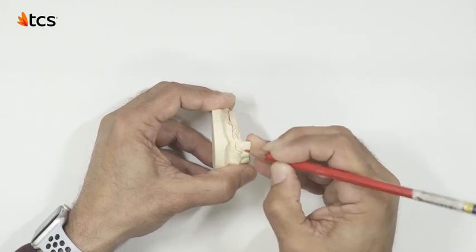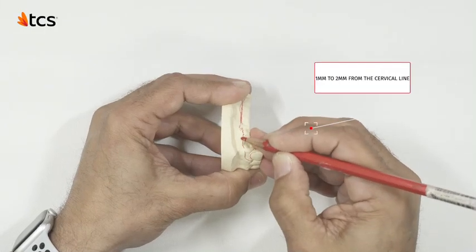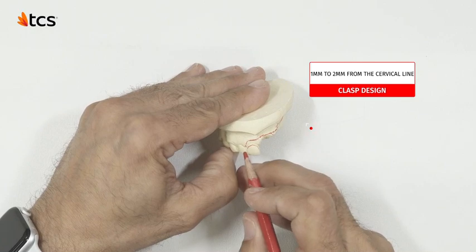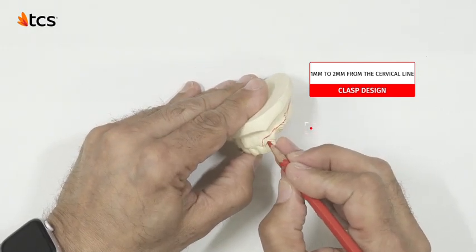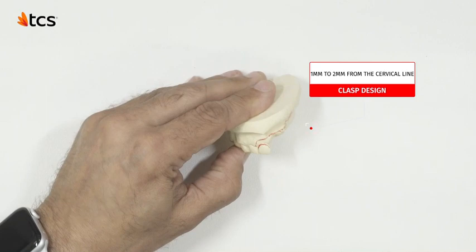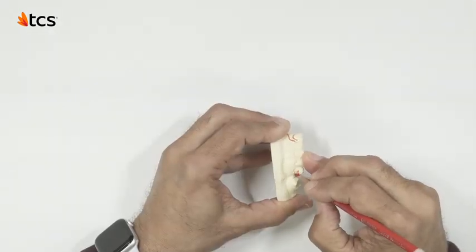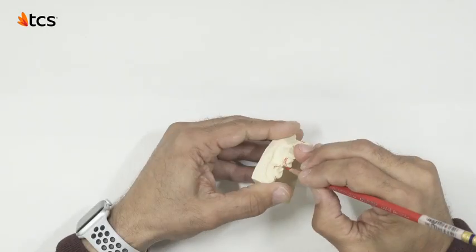As we establish the anterior clasp design, we follow the height of contour and the patient's natural cervical line, concealing a portion of the tooth from the cervical line to about 1 to 2 millimeters on the facial of the tooth. In this section, we added 2 small finger clasps for retention.